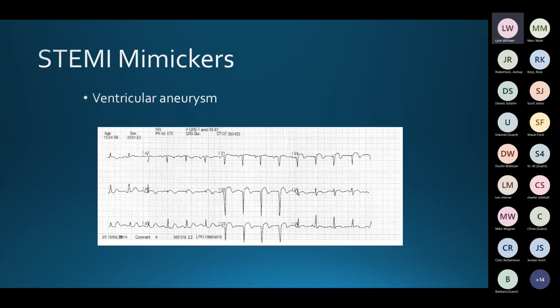But without knowing it, if he was having chest pain, shortness of breath, and you saw this, I would be happy to have you call it. Just know that an occasional one will turn out to be a ventricular aneurysm.